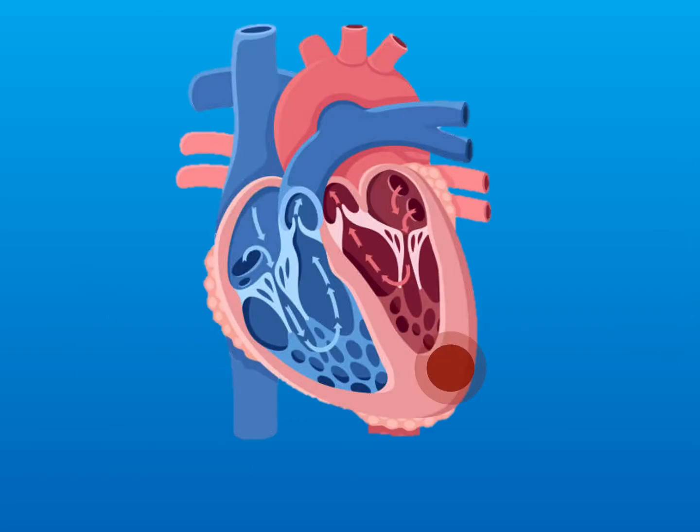When you have damaged myocardium, you can have a reduction in the degree of depolarization running through that damaged tissue. It becomes electrically silent. A lead looking directly at the site of damage will see a negative deflection, a Q wave, which is an initial negative deflection. And this Q wave will correspond to looking through the damaged electrically silent myocardium to the healthy myocardium on the opposite side.